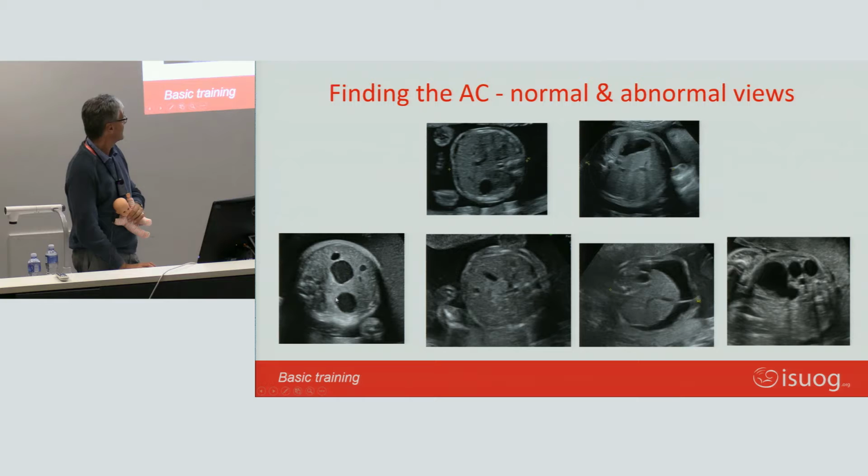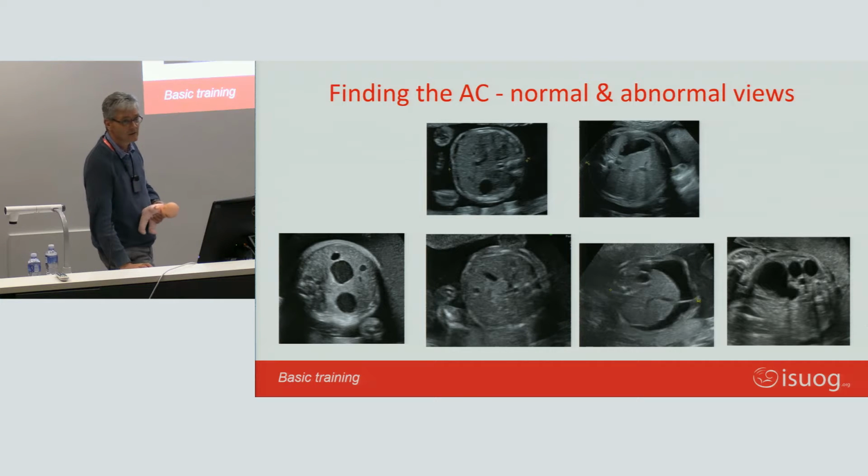And what is the most common single underlying cause of this? Down syndrome. So you see this, you start reaching for, not you, but the referring center starts reaching for the needles for amniocentesis when you see this. Okay, we try to count to 1, but we don't even get to 1 because there's no stomach bubble. So what's happening here?